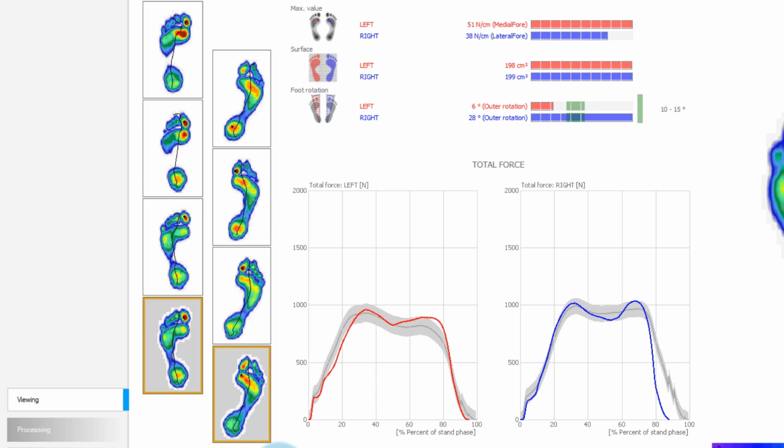A single strongly deviating step can cause a distortion of the mean values with a usually small number of total steps. If this distorted mean is then closer to the deviated step than to the mean of the remaining steps, then the outlier is selected as a representative, which can possibly be a hindrance in the interpretation of the data. It is best ensuring that you eliminate outliers based on a visible footprint image, the COP line and the contact time during the data analysis. With a trained eye you can even control this during the data acquisition.